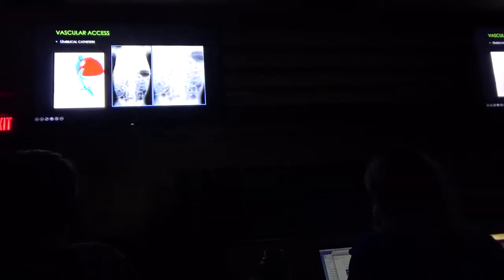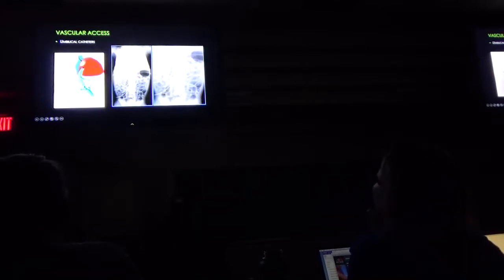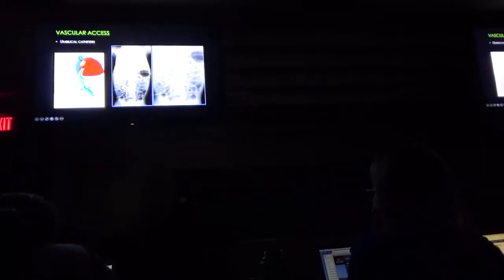I've got another picture of this. I don't know if you'll be able to appreciate that or not. Look at this line here. And then bam, it stops there and then starts back up there. These lines can fracture. That's what that would be called.